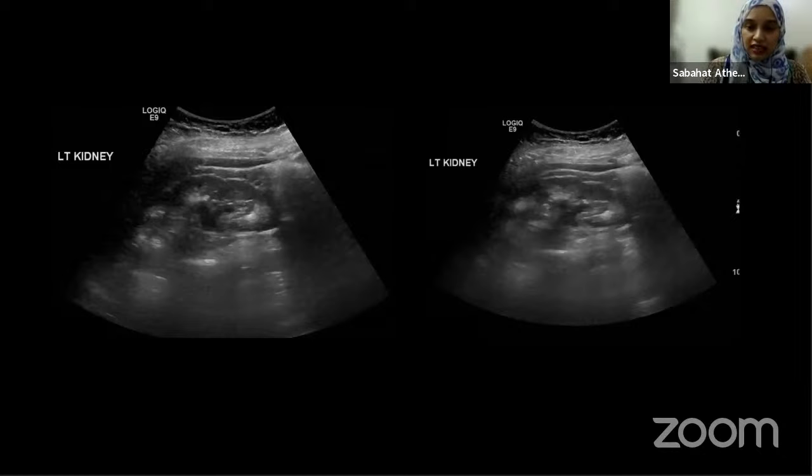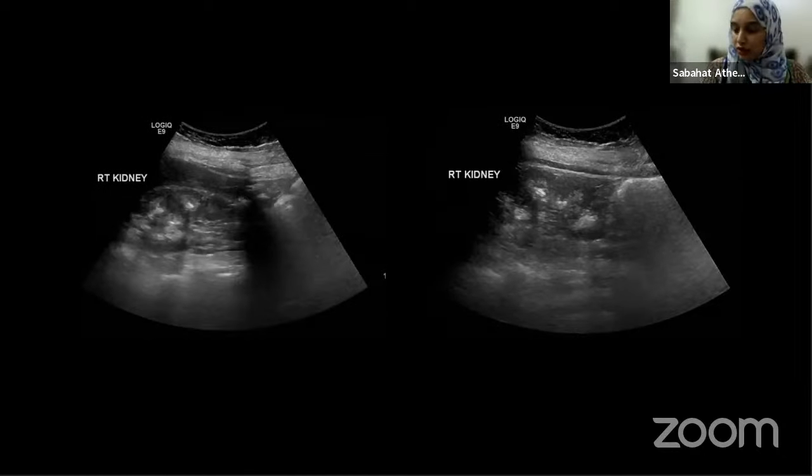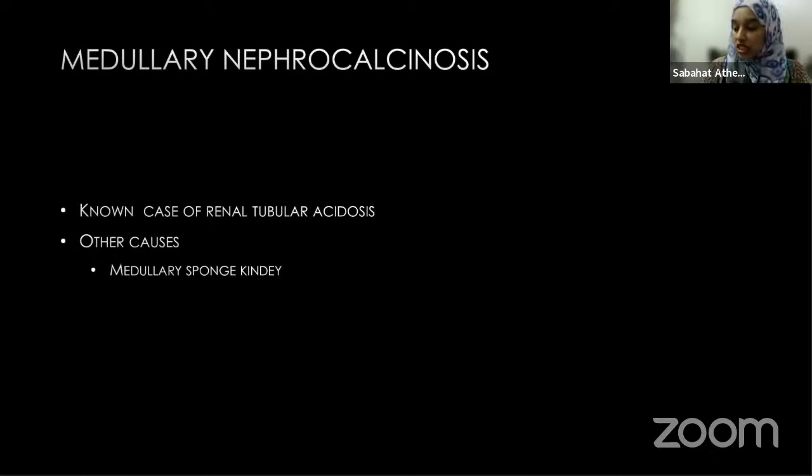Do you think anything is away from the normal or something different from the normal? Excellent. So what you can see is that the cortex, you can very finely see the cortex. The cortex looks fine, but the medulla is echogenic. The medulla is echogenic. It's triangular, okay? So the terminology for this would be medullary nephrocalcinosis. Now, what are the differentials of medullary nephrocalcinosis? As somebody said, medullary sponge kidney, yes. This particular patient was a case of renal tubular acidosis, okay? But as mentioned in the chat, yes, medullary sponge kidney, hyperparathyroidism, these are other causes of medullary nephrocalcinosis. Well done.